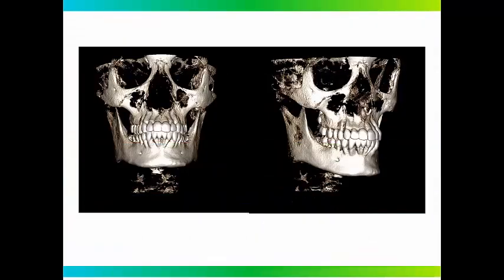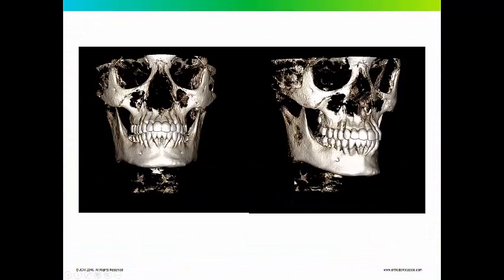Okay, so here is a 3D reconstruction. You can kind of get an idea. I adjusted this to make it correspond with the individual slices as much as possible. And you can see where these roots are. And you can also see where the space came from to align the teeth. It came from really overexpanding the intercanine or intercuspid width.